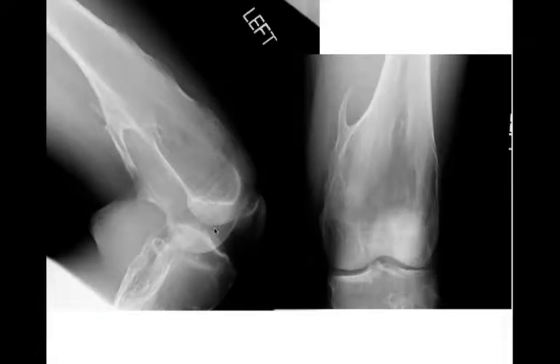Okay, so two views of the knee. Again, this is classic. This is an Aunt Minnie. You should look at this and say, well, these are really just osteochondromas in a patient with hereditary multiple exostosis. Here's this kind of pedunculated one pointing away from the joint as they do. More sessile one here, and then involvement of the proximal fibula, which we're not seeing very well here. So classic multiple osteochondromas. They all look very similar, so once you've seen a couple of them, you should start to recognize what the rest look like.